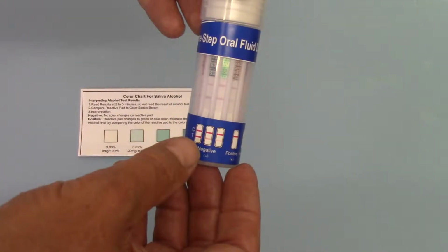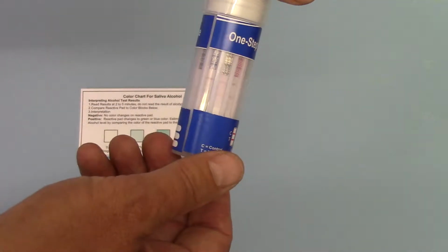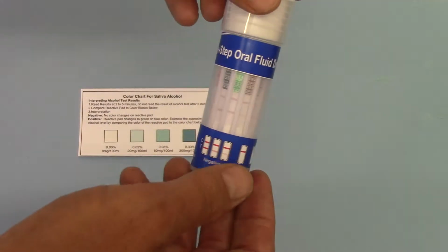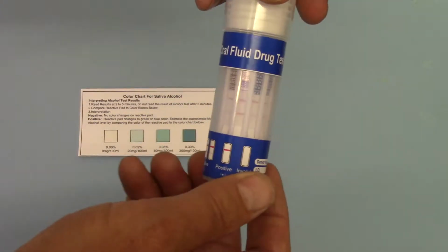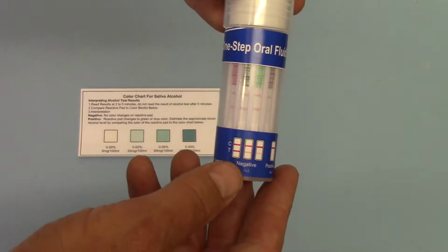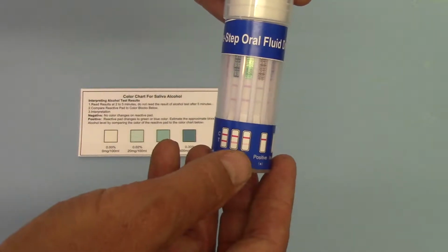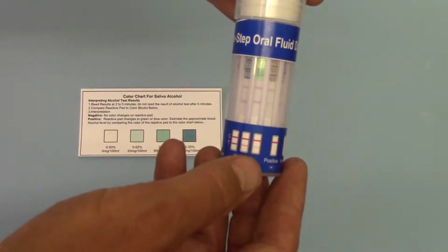results panels here, you need control lines, which is the upper line on all 11 of the drug screens, and we've got, if I rotate that round, nice clear control lines showing on all 11 of the drug screens. And then, interpreting your results, you're looking for the presence or absence of a test line. Now, you'll see three demonstration test lines being given here, from very dark to very faint.